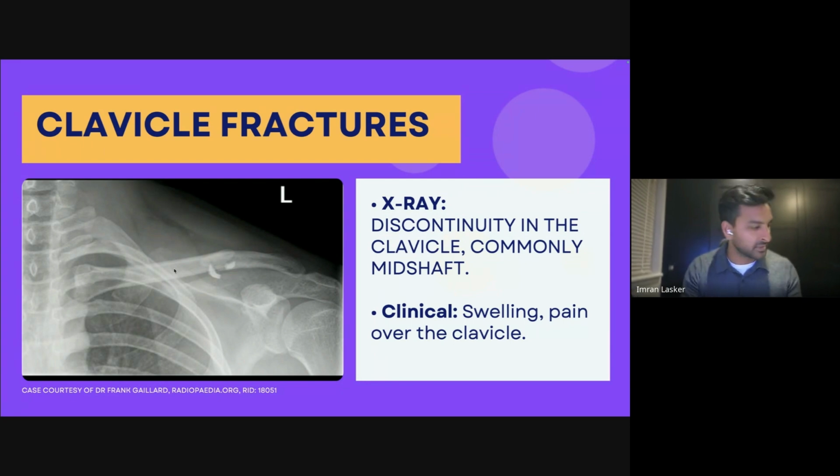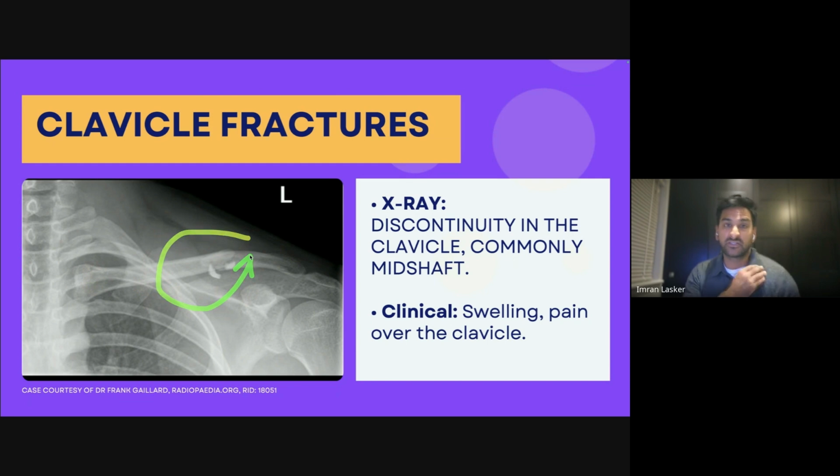Now, what you'll find when you are looking at these traumatic injuries is that most of the time it's going to be the middle third of the clavicle that's fractured, not the medial third and not the lateral third. Usually it's the middle third, because that's where someone gets a direct traumatic problem. It has to be quite a hefty injury to get a fracture near the sternoclavicular joint, and it's unusual to get one in the acromioclavicular joint. What they generally say is that when you get injuries around here and here, there's going to be a concurrent abnormality. It's either going to be rheumatoid arthritis, inflammatory arthropathy, or osteoarthritis that can cause that.